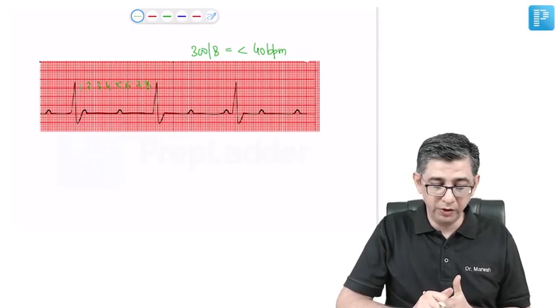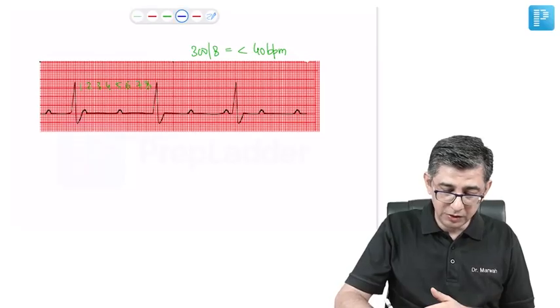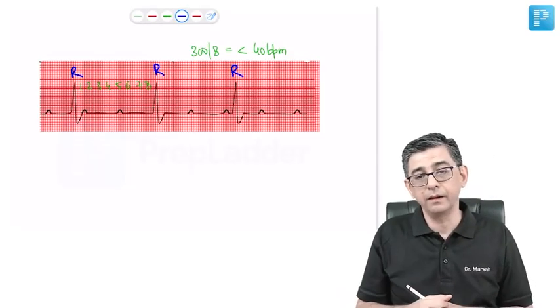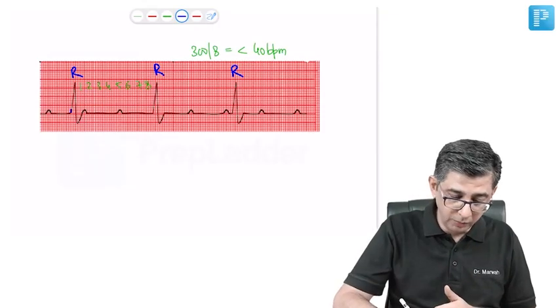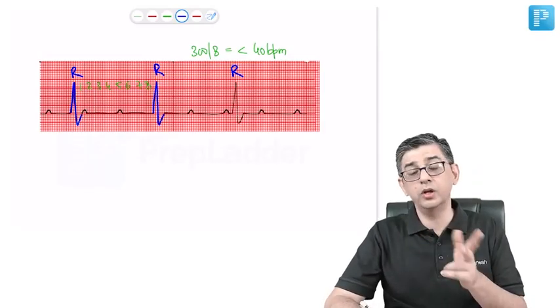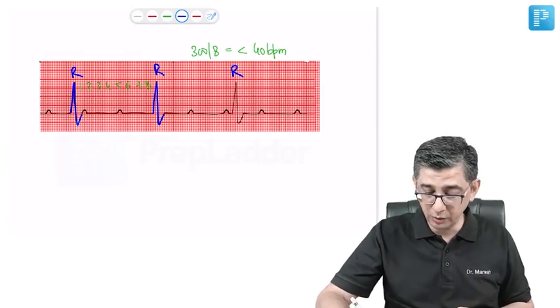And then what I'm noticing is that in this particular ECG recording, the number of R waves that you are counting is only 3. Even the QRS complex of the patient is relatively broad. Every time there's a QRS complex, it's broad. So I was teaching you broad QRS complex tachycardia. Now I'm teaching you broad QRS, but there's a bradycardia occurring in the patient.